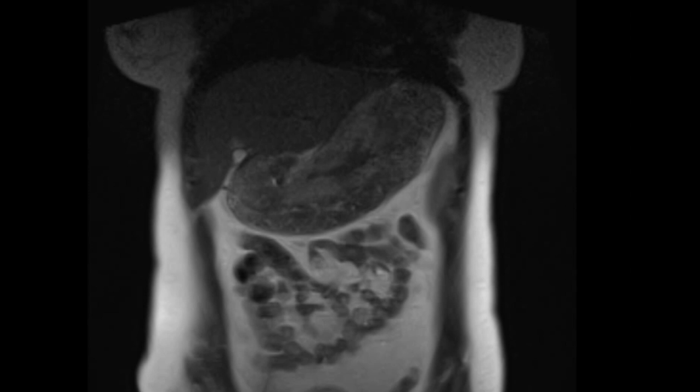It's like a cast. It takes the shape of the stomach perfectly because over the years she's been eating, I don't know, hair or whatever. Most commonly in our part of the world, it's hair. There are others like phytobezoar and so on. So it's a typical bezoar, but on an MRI. Usually we are used to seeing it on a CT scan.